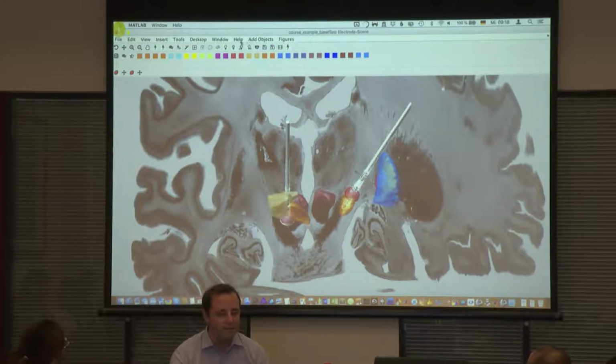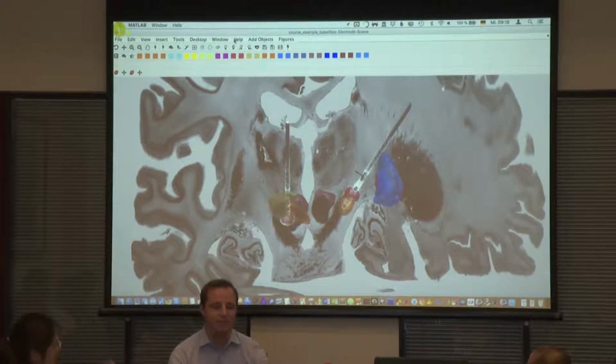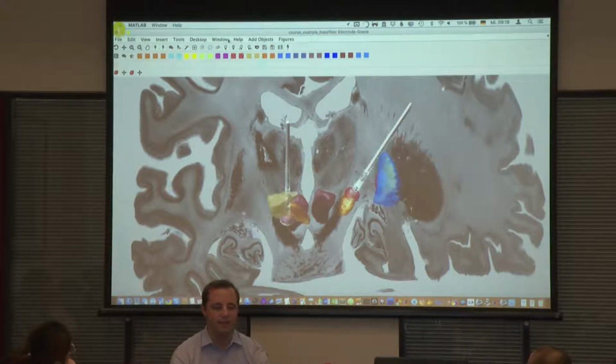Like that, you see, so it's a bit different lighting. Maybe check on your computer so you'll see it better, but now it's all a bit darker. And sometimes depending on the scene, it may help to change the light. Maybe helpful. So you have 4 different lights in the scene and you can turn them each on and off.